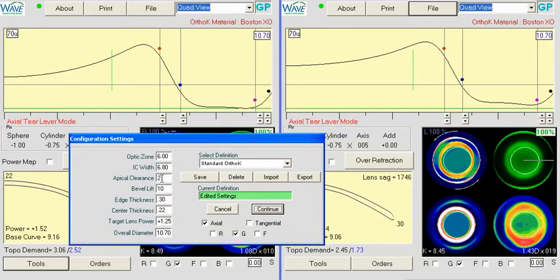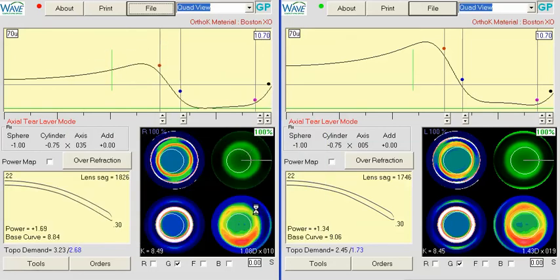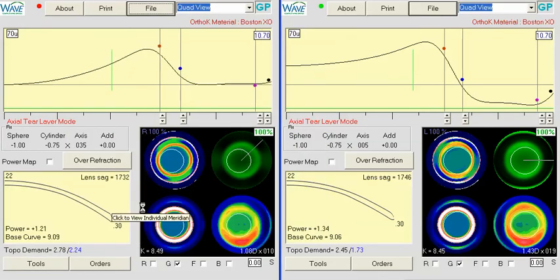Everything here should match pretty much what you have, except our apical clearance is going to be quite low, around 2 microns or so. It's going to be axial mode like you're in right now. GSIM I think will work fine, and then we'll hit continue and let the computer do its work.